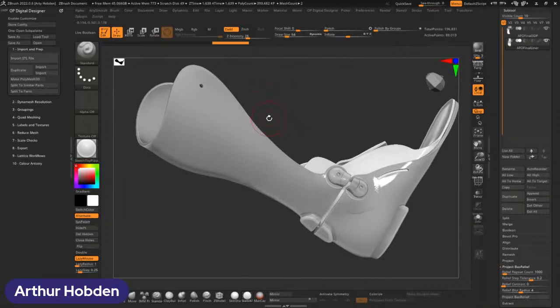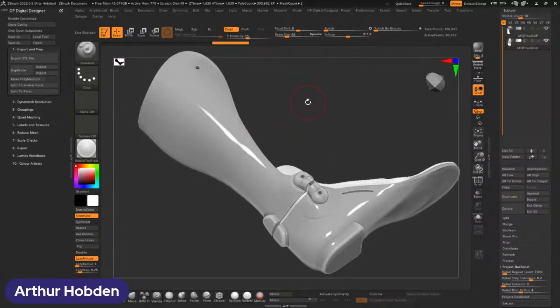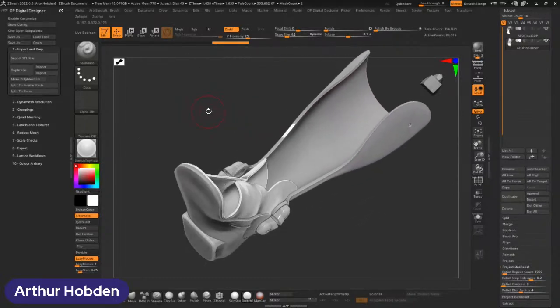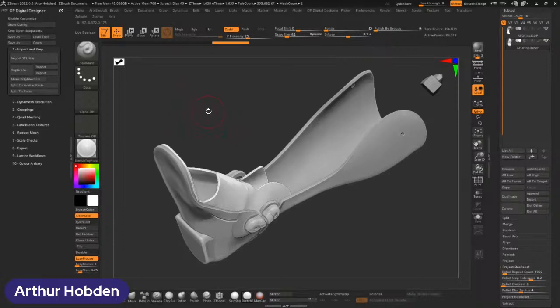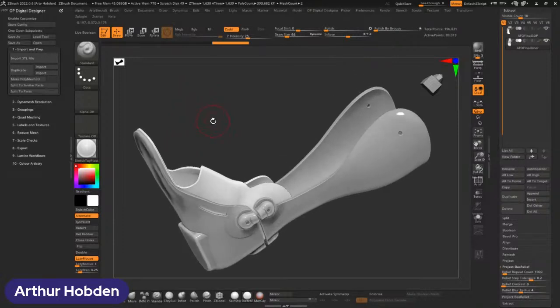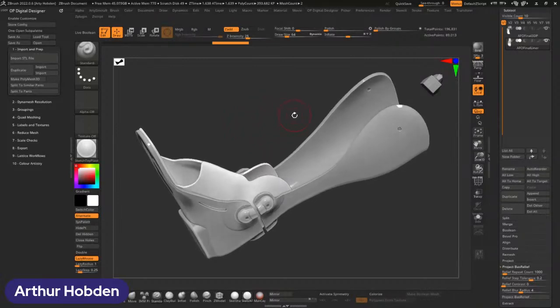This is one of the main reasons why I recommend getting into ZBrush if you haven't gotten into mesh modeling yet, because of the added benefit it has when working from CAD back to mesh. You don't get those with Meshmixer, for example, even though it's free. So by deciding to learn ZBrush in the beginning, you get access to these extra supplementary tool sets and workflows that can really bring extra value to your devices. So let's explore that today right now.